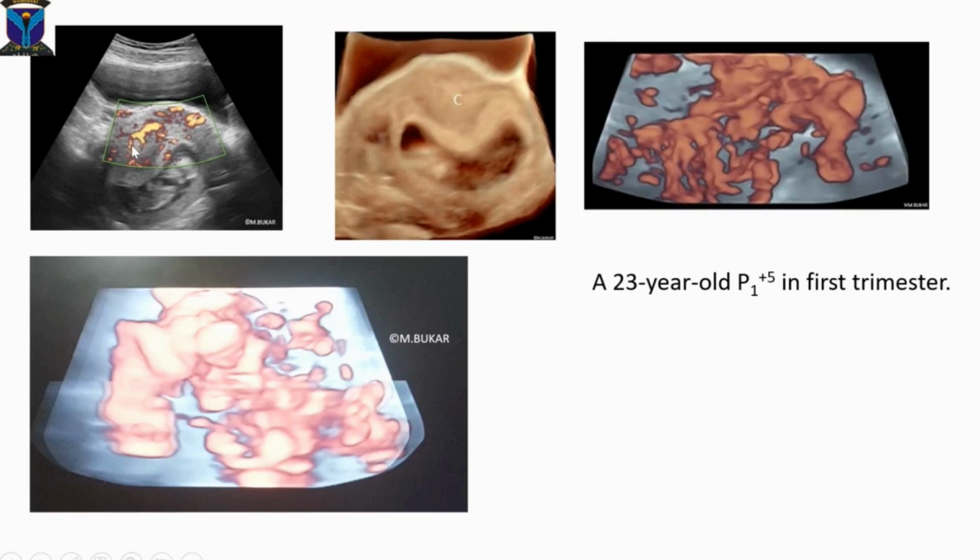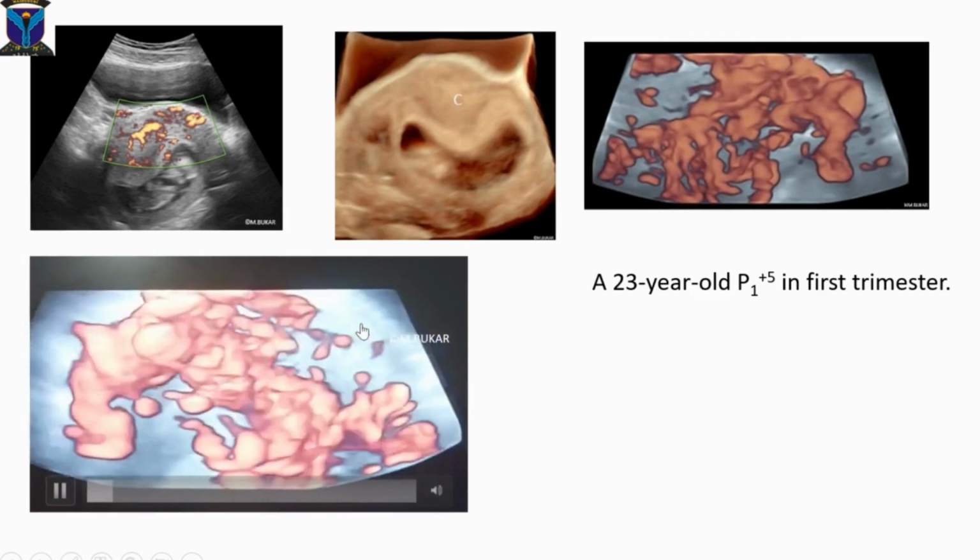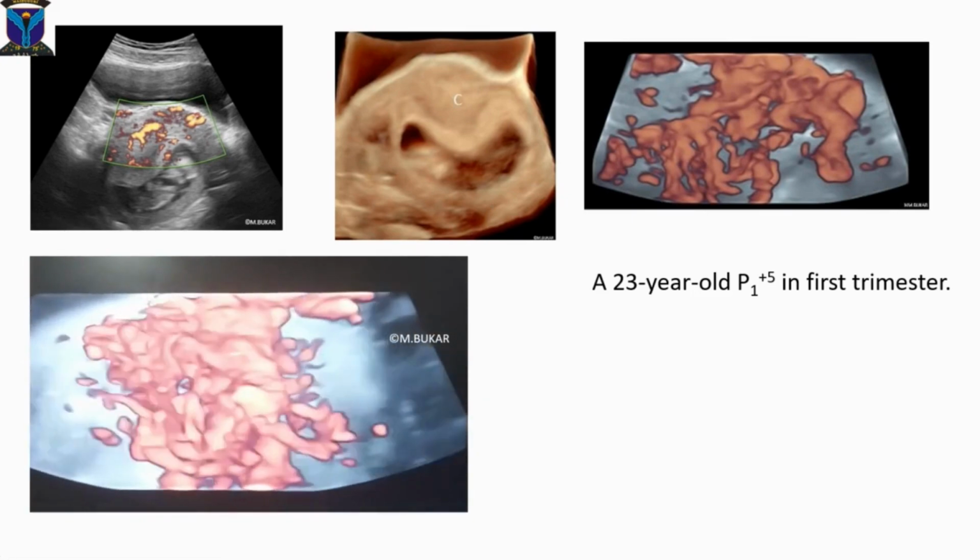This was a uterine contraction in the first trimester of pregnancy. And these are the dilated arcuate vessels as a result of pregnancy. So you can see the dilated arcuate vessels and the cine loop of the same case.